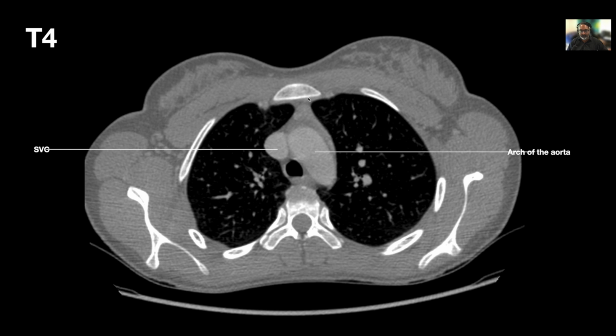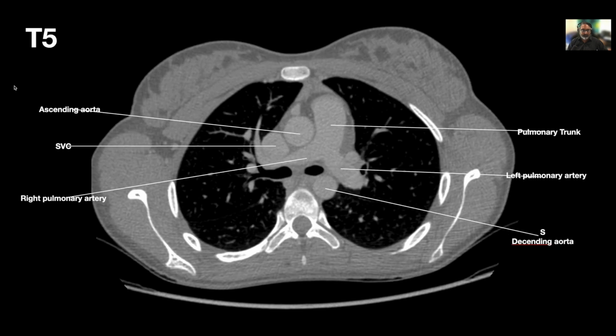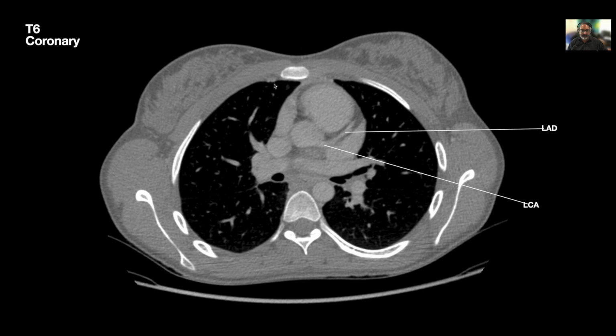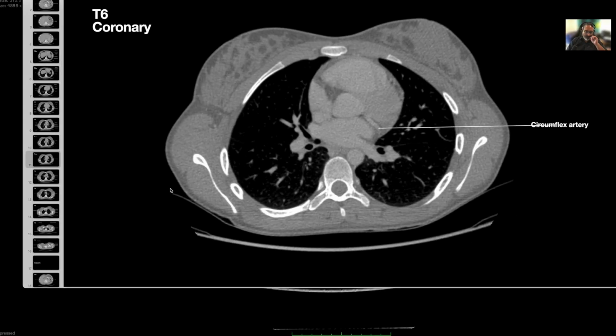The artery is more lateral here. And you'll see it at every level. Oh, that's a bit high. But if you go lower down, it doesn't show too well here, but you can see it here. Here it's also right. Yeah. Little bumps, absolutely. And the azygos we didn't do, but I'll show it to you again so that you remember it.